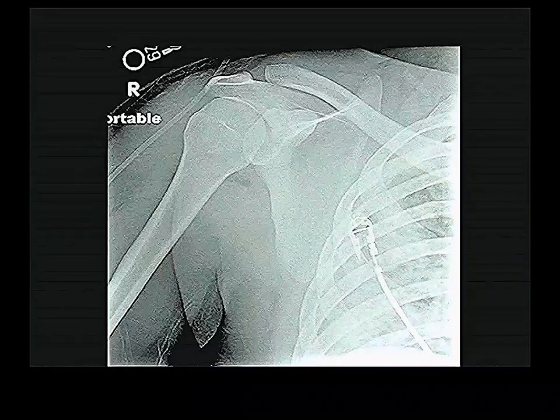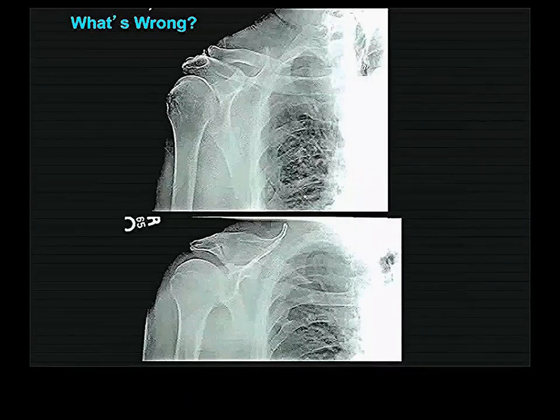It's called, not a word you're going to need to know in this course, diastasis of the joint. The surfaces have been pulled far apart because the actual ligaments which run between clavicle and acromion have torn. But the ligaments which run between coracoid and clavicle have not torn. So it's almost a shoulder separation, but not as bad as one because the coracoclavicular ligaments are still intact. The trauma that produces a shoulder separation is the same as one that produces this diastasis, but it's just of a milder degree. I just put this in because I think they're interesting anyway.